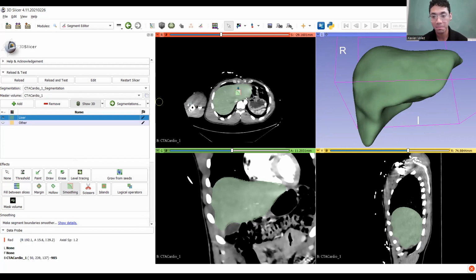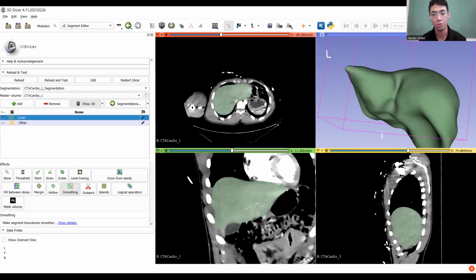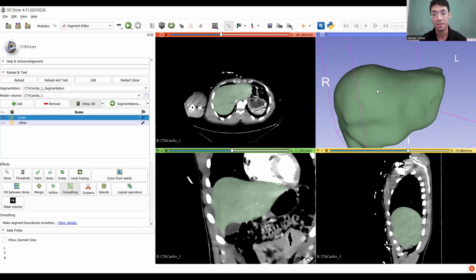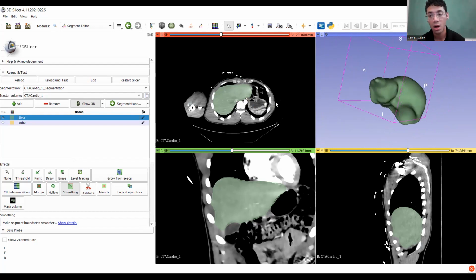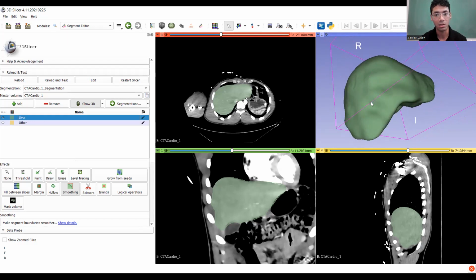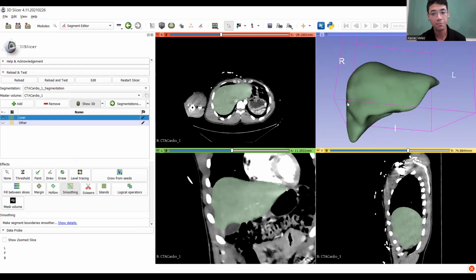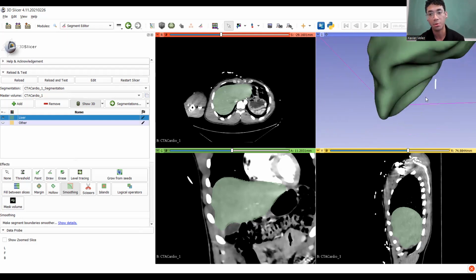So from this step, pretty much you're just going to be going in and identifying the places that you don't like and filling them in slice by slice. So again, this is probably the step that can take the longest if you want it to. Or I got to be honest, recently I've just been skipping it because I will manually post process these models. So if they're a little rough, I'll just sand that out because it's what I'm going to have to do anyway. But for this, I'll at least demonstrate a little bit something that we might want to do, but won't spend too much time on it.